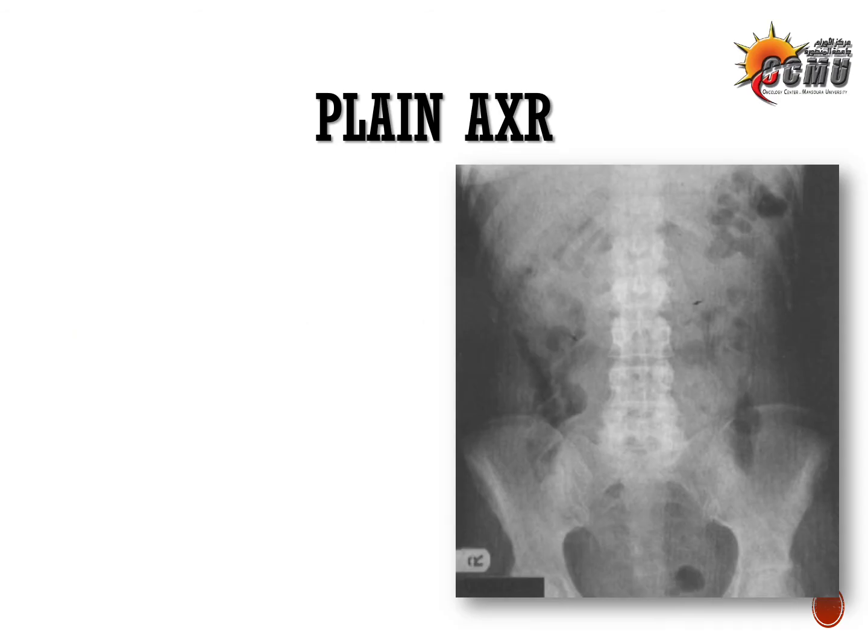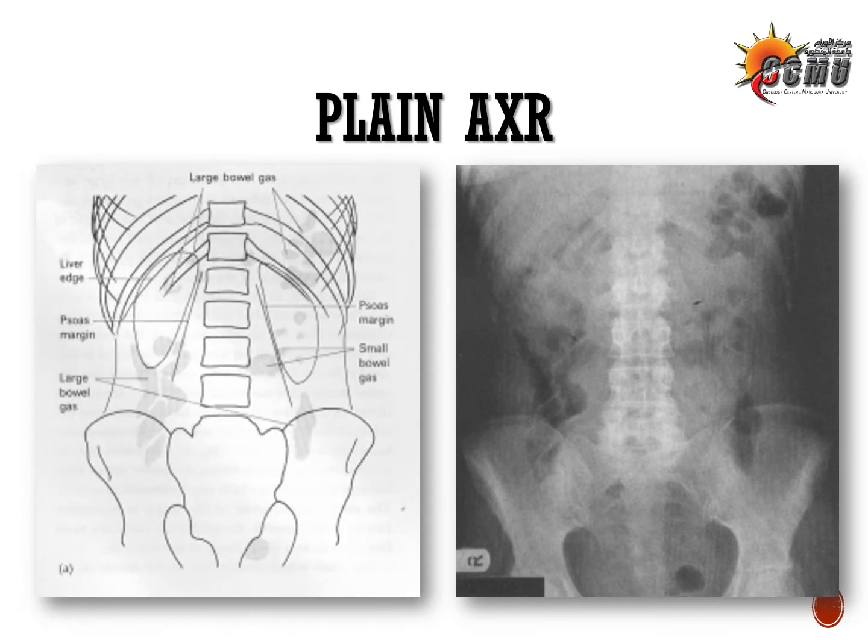On a normal plain abdominal X-ray, you may encounter such a film. And actually, in this film, if you zoom in, you'll find different shadows that should be explained. Like, for example, on the upper left and right in the peripheries, there are densities of air or gas inside the large intestine. So large intestinal gas is distributed peripherally.